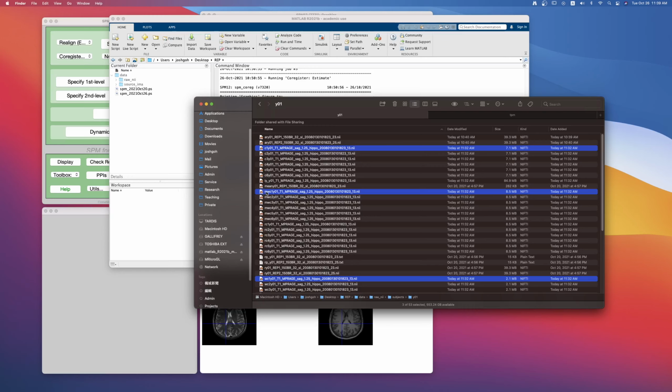But here you have the intensity changed so that you preserve the original shape information by converting it to densities. Okay, and then you also get the RC1, C2, C6. These we will use later on in the Dartel case.